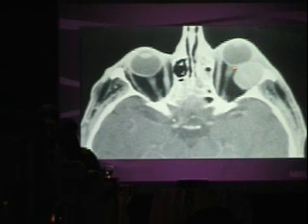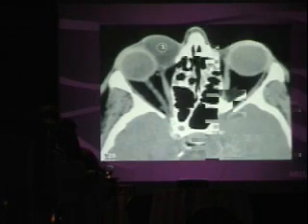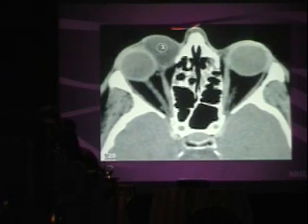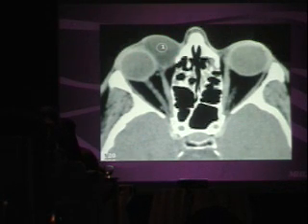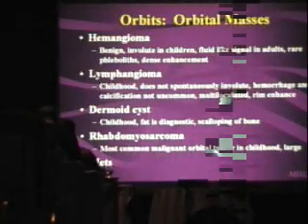All right. Whereas if you have a true benign mixed tumor of the lacrimal gland or a post-traumatic lacrimal hematic cyst from the subperiosteum here, that's going to indent the globe and push the globe and bend the globe and cause proptosis. If you have a low attenuation mass near the origin of the lacrimal duct, most of the time it's just an obstruction of the lacrimal duct, causing a little saccular region that's obstructive, but it can also be a very common location for a dermoid, around the base of the nose or just lateral around the nose, and that was actually a dermoid cyst.